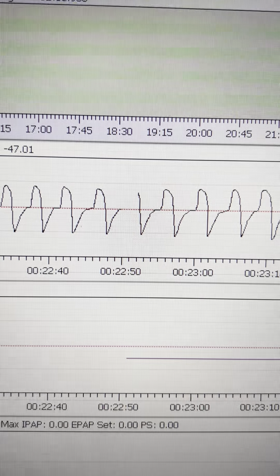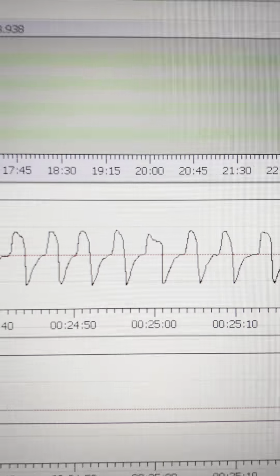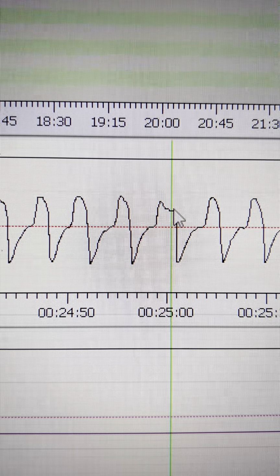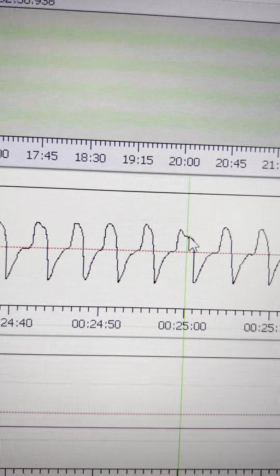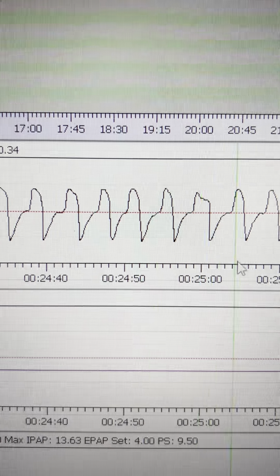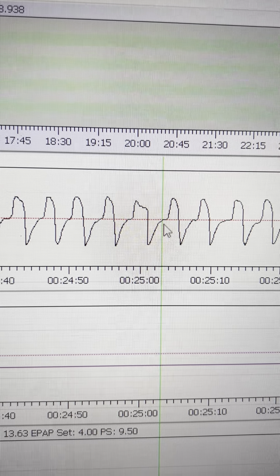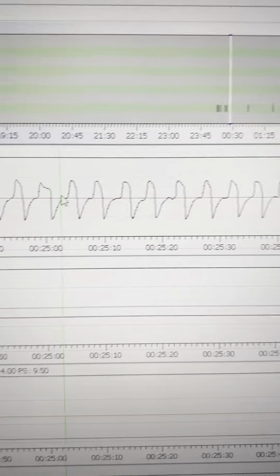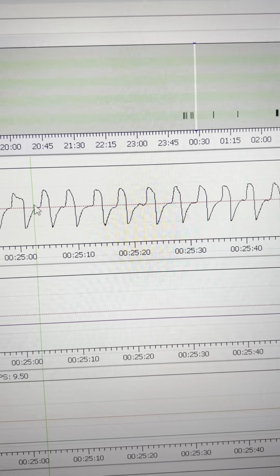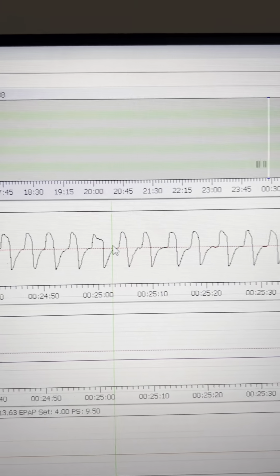So further examining the breaths. This one right here, you can also see some cutoff. So here my tongue is probably collapsing again, or the airway, or my nose. But although I don't think that you can see my nose being on here that much, because if my nose is half clogged right now, the PS is so high that it just overcomes that through one nostril. So I never really feel resistance from my nose that much anymore when sleeping now.